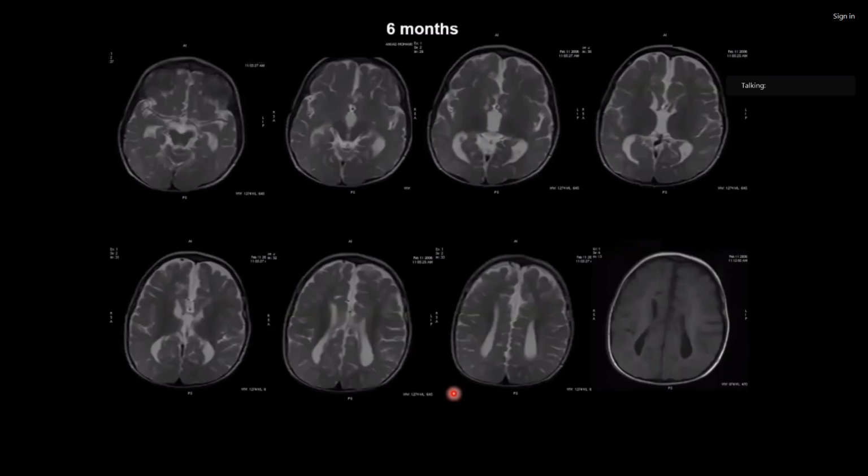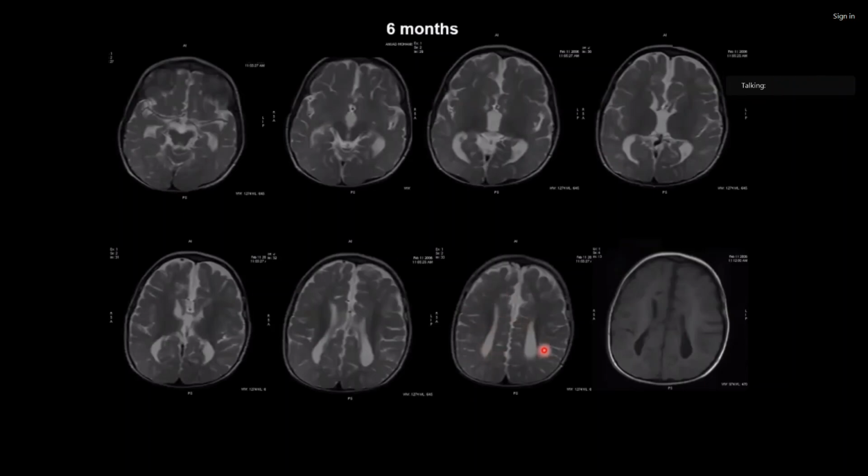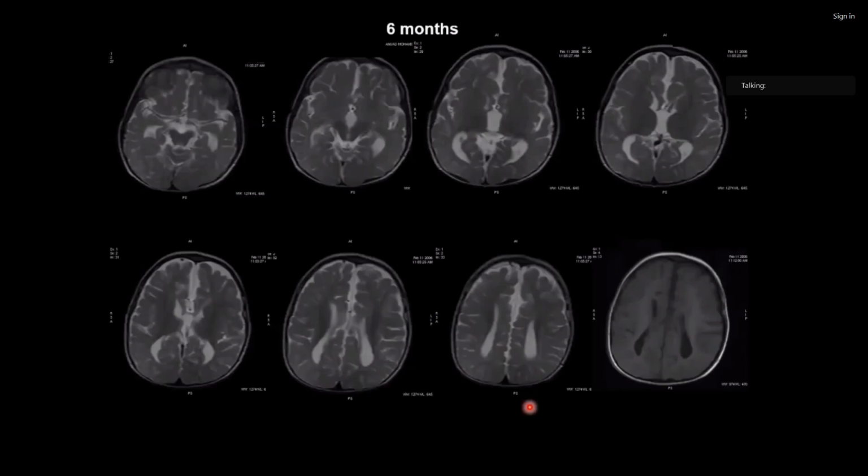And in the second row, third image, there is a hint. You have picked up the ventricles. Look at these two ventricles. Yep. So I was wondering, this is a racing car configuration. And the specific term just escapes me now. It's a racing car configuration abnormality, and I just can't remember the name of the pathology. What is your diagnosis? I can't remember the name, sorry.